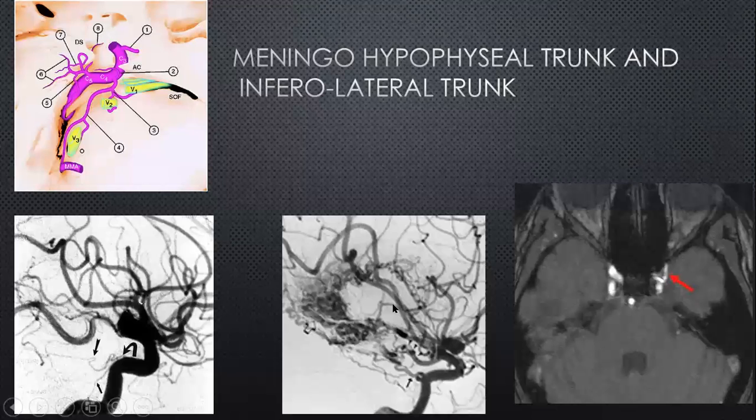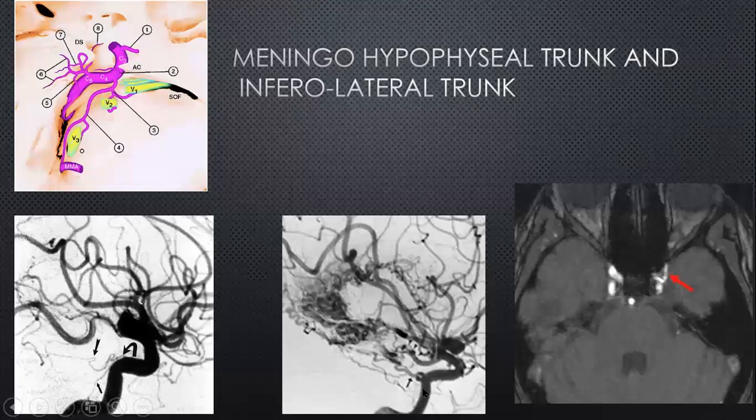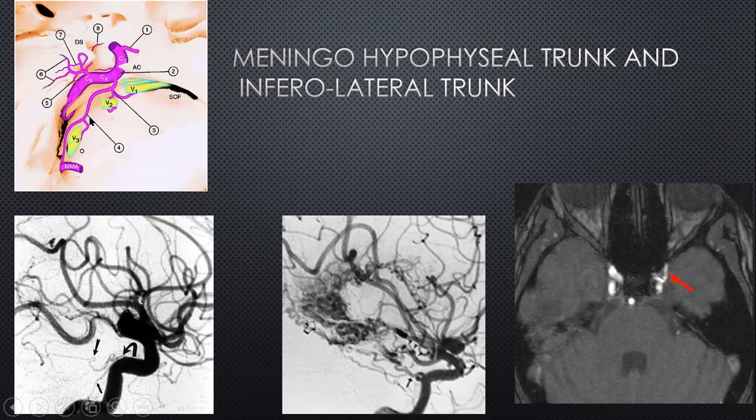For example, here this is a patient who has got a vascular malformation within the right hemisphere, and you can see it's supplied not just from the leptomeningeal vessels and the choroidal arteries, but also has derived branches from the cavernous portion and the petrous portion of the internal carotid artery, supplying that vascular malformation. These arteries are also very relevant during the development of the ophthalmic artery, and we'll come back to that in the next slide.